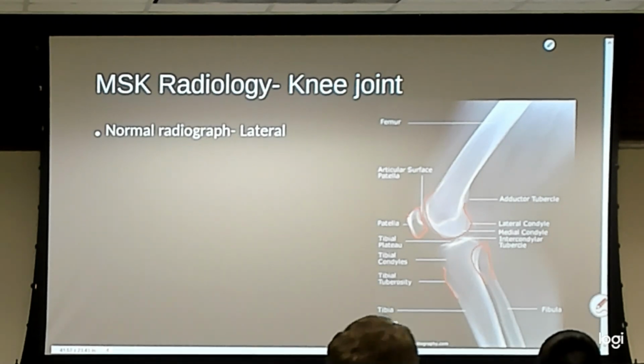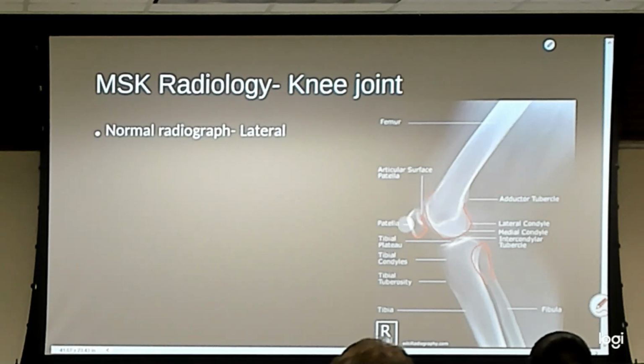That bump is the attachment to the patellar tendon. We'll get to talk about that when we get to our pediatric knee conditions lecture, and Osgood Schlatter. Let's see here, quadriceps tendon. Let me take my patella marks off so we can appreciate that.